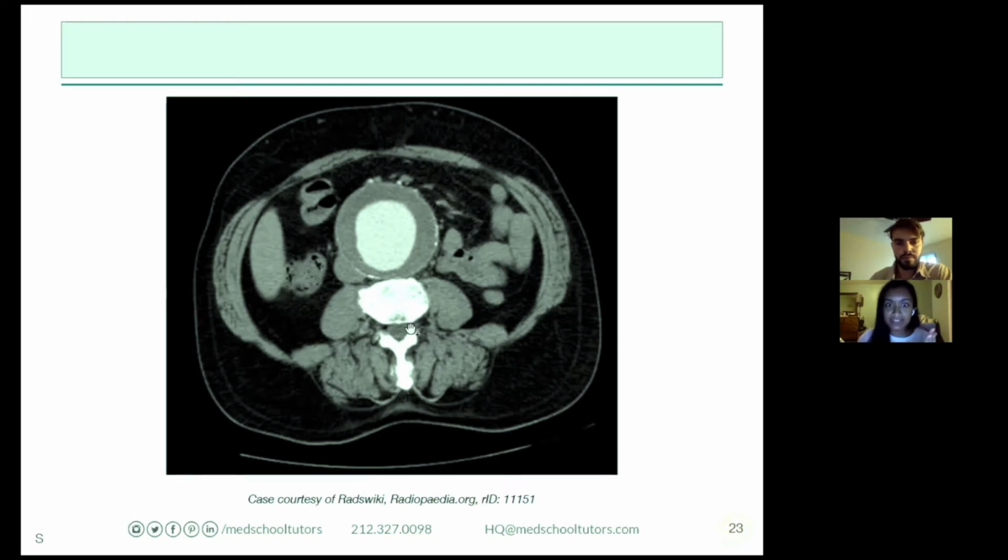So the first thing that catches my eye is this huge structure here with what looks like a lot of contrast material and this sort of concentric ring of darker material. So just checking my bases, looking around, seeing what else is there. Maybe this is the edge of the liver, hard to say, some bowel, not a whole lot else going on. But again, where am I, right? What am I looking at?